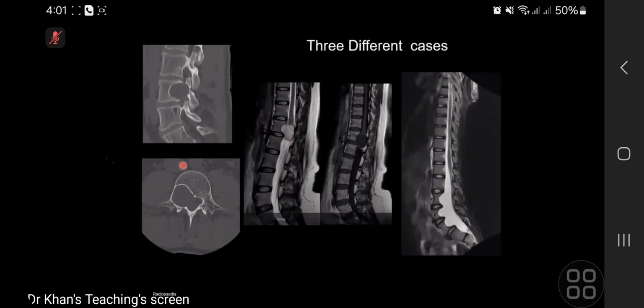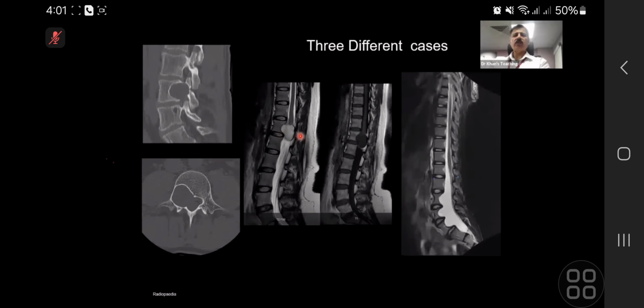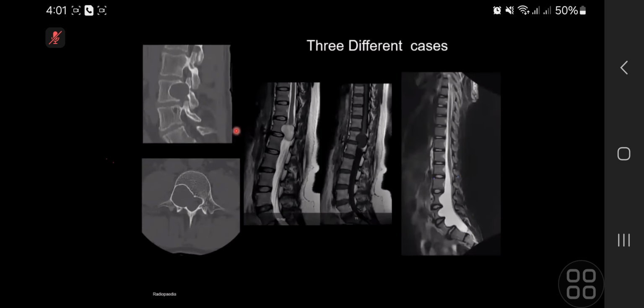Yeah. This case, again, it is similar to this case, but this is a CT scan. It is not the same case. And it is also schwannoma slash neurofibroma. Of course, you don't have evidence more than that. Okay, all right. Actually, this was the last case of the day.